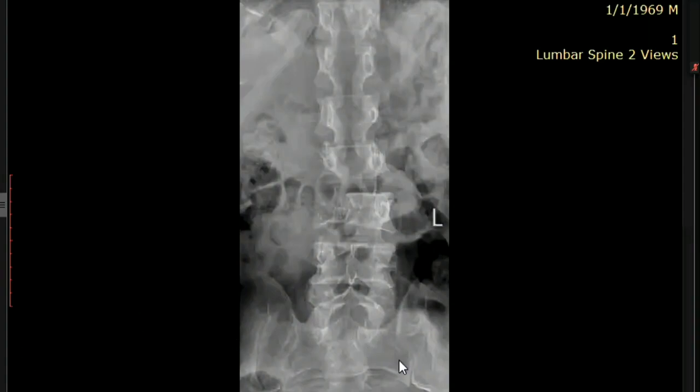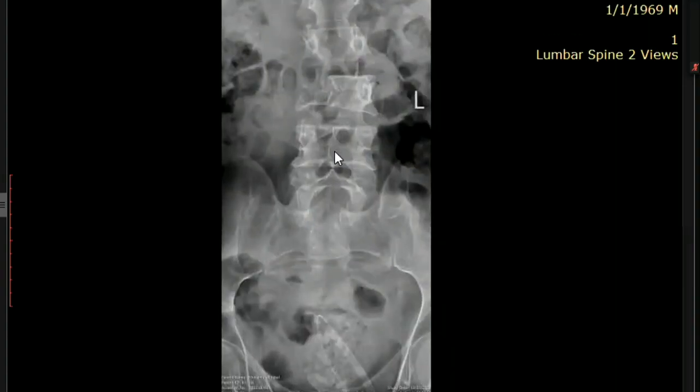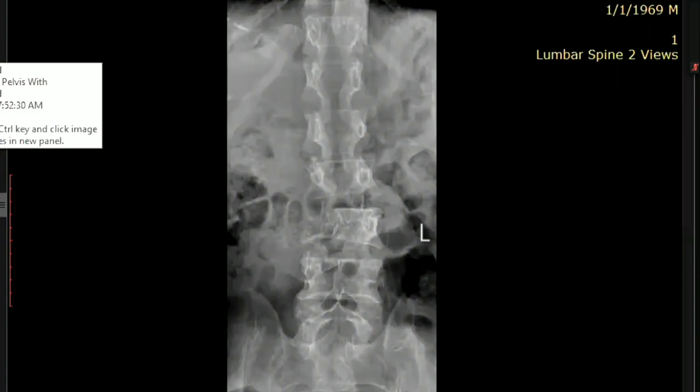So, based on this, my differentials, if this is an old age patient, include a metastatic process or multiple myeloma. It appears to be a pathological fracture. Okay, so how would you like to proceed further? So next, I would like to do a CT scan.